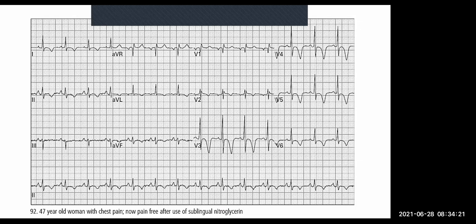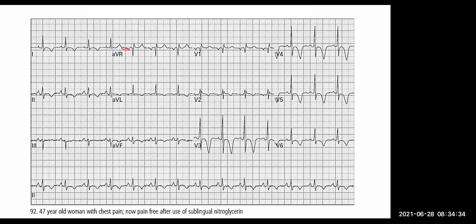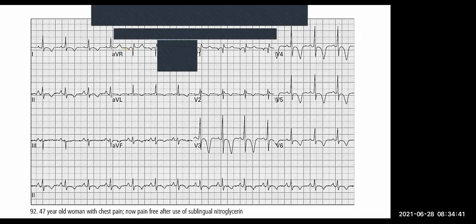Specifically here, what would you call that? Let me draw. Yeah, 100% right. Because let's start a line from there. All right, so this you could do with, what am I drawing? I'm supposed to draw. To draw this, right? So let's start from there.